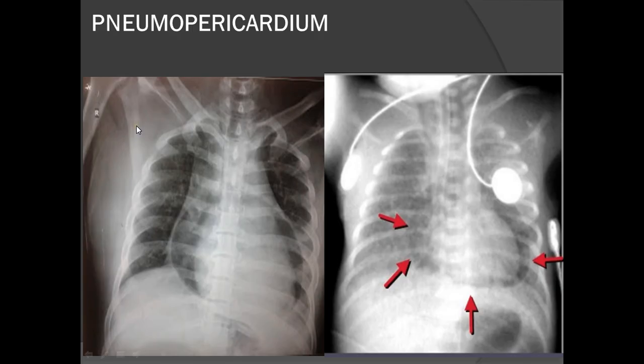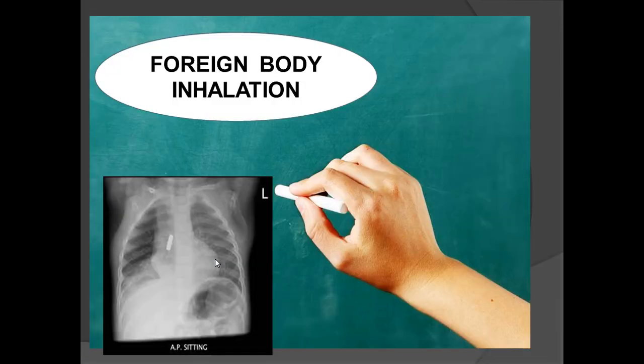And what happened here is pneumopericardium: air is surrounding the heart, and it's seen within the pericardial sac. So it is causing a compression effect over the heart, the tamponade effect. So the patient may have muffled heart sounds or some serious kind of emergency.